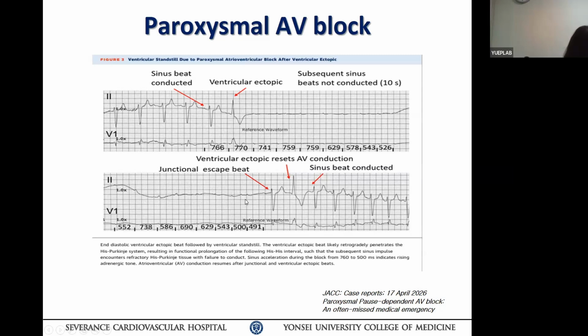An important clue is that the sinus rate accelerates during the AV block, reflecting rising adrenergic tone, and helping to differentiate this condition from vagally mediated AV block. Finally, a junctional escape beat or ventricular ectopic beat resets the conduction system, allowing the AV conduction to resume.